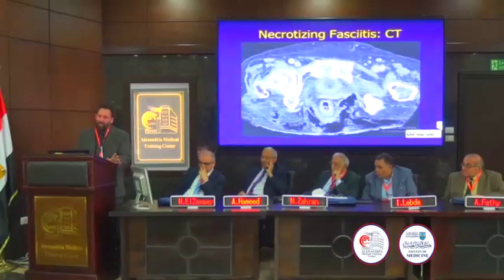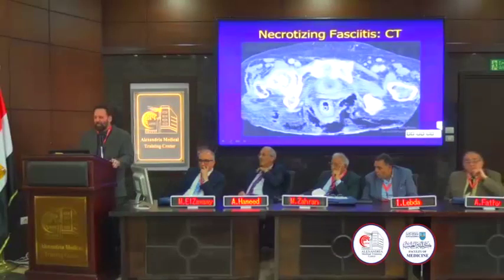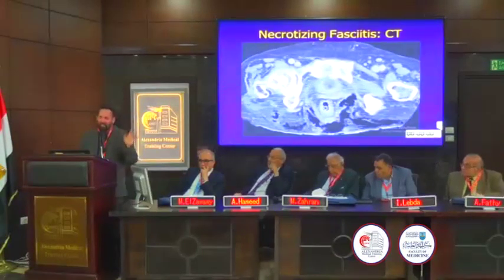This is a case I saw many years ago. By the time I read the case and called the doctor, the patient had died. And I read it within 10, 15 minutes. So all this gas all around, they were on chemotherapy, common reason to get necrotizing fasciitis. And we see a lot of gas. It's very classic. Nice slide, very bad disease formation.